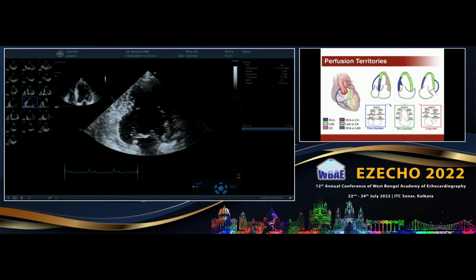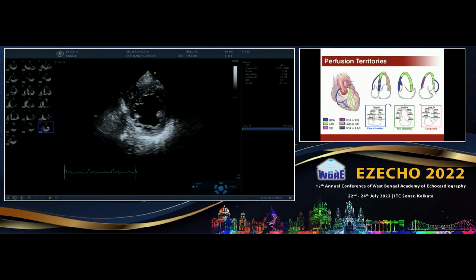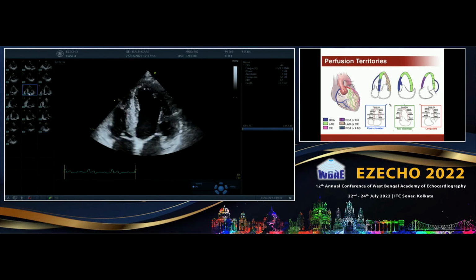And as you know, at the basal short axis, take one short axis view, we have got the 6 segments at base, 6 segments at the mid. Apex, we have only 4 segments. So which 2 segments are not there in the apex? You don't have inferior septum there.